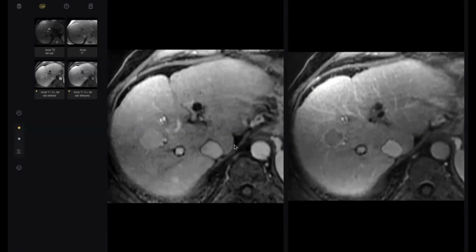Doctor, why is this not cholangiocarcinoma? Give me two or three causes. Sir, one of the reasons is that cholangiocarcinoma has increased enhancement on the delayed phase. Excellent. Secondly, it has a capsular retraction. And thirdly, there should be at least some background ductal dilatation, which is not present in this case. More than excellent. Thank you, doctor, so much. It was a case of HCC.